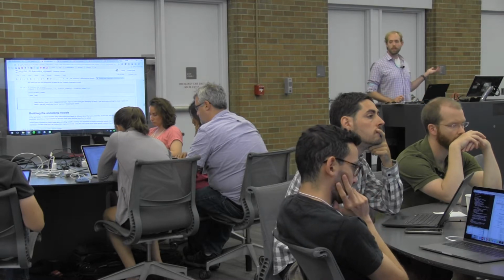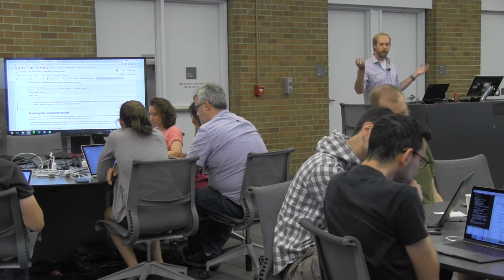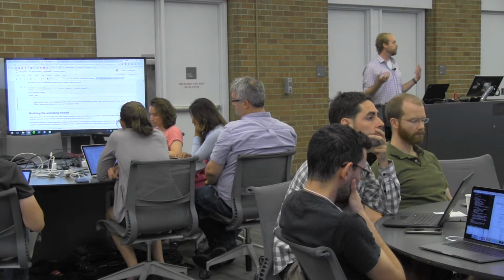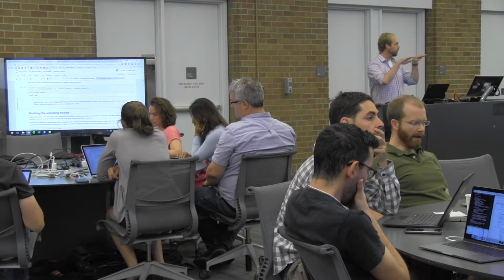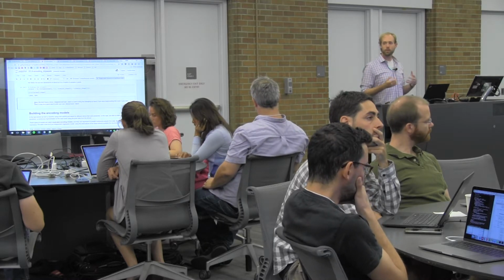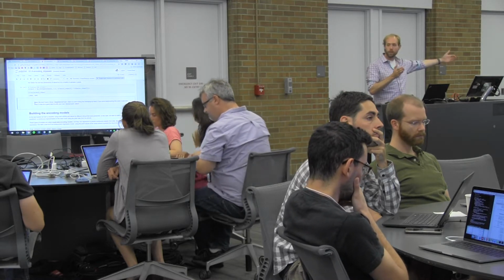So in the previous example of this, we used something like a NiftiMasker to go from volumetric data into scikit-learn style objects. We're doing something similar here with the image data now, because this is a more complex kind of stimulus representation. We've gone from a 10 by 10 image to this vector of length 100. And what a lot of people do in their own workflows is implement their own version of a NiftiMasker so that they can retain information about where each pixel goes relative to one another after they've unraveled it into a length 100 vector.